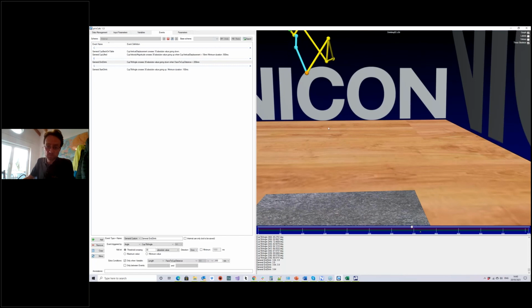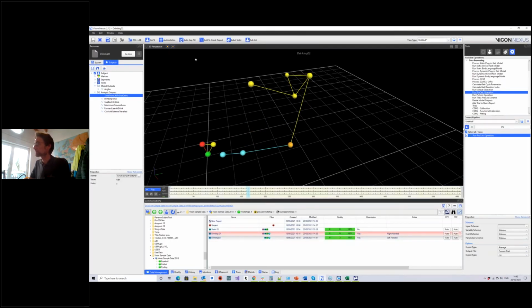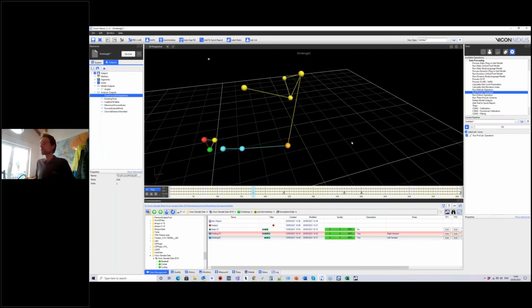So that is a small improvement to the event scheme in this case. And if I go back and save this, then I can pop back into Nexus, run the ProCalc thing again, and we have 4 events instead of 5. It really is quite cool the way you can swap between Nexus and ProCalc and just do the calculations more or less on the fly.